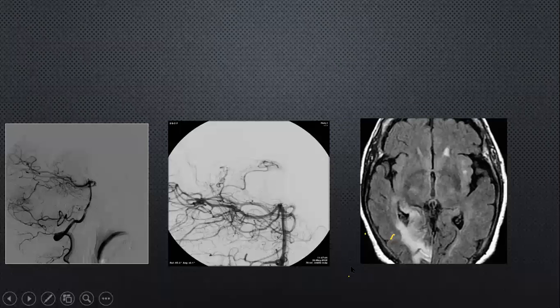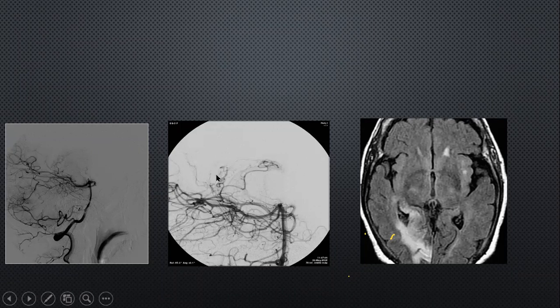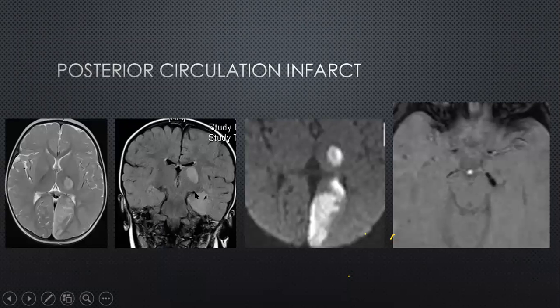And this patient with infarction, just to identify the occipital lobe infarction in a different patient. So not only do we have the cortical branches, but it's important to realize that the PCA also has very important perforated branches supplying the thalamus, the posterior limb of internal capsule, and the upper midbrain. And this is to share that philosophy again. Not only do PCA infarcts affect the occipital lobe, but also the thalamus and the internal capsule.